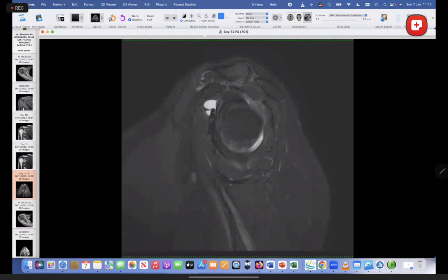Aisha, what do you think this structure is? The biceps femoris tendon? That's somewhere in the knee, if I remember correctly. The biceps femoris? No, sir, biceps tendon. Sorry, I just wanted to say biceps.